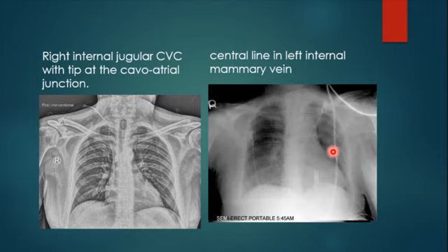So when they fixed the problem, repositioned the endotracheal tube, and also put in a chest tube, the problem of the central venous line was demonstrated more clearly, that it had entered through the internal mammary vein. This is unacceptable. So they will reposition it later.